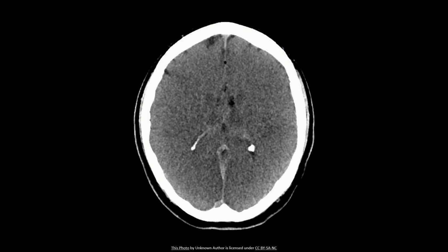So deviating from topic a bit, can you guys see this white, highly dense structure? What do you think it could possibly be? Well, it's not a pathology. You should know that as we age, there are some degenerative changes which happen in the brain. And one of them is that certain structures in the brain undergo calcification. This is a totally normal process. So in this particular case, it happens to be the choroid plexus.